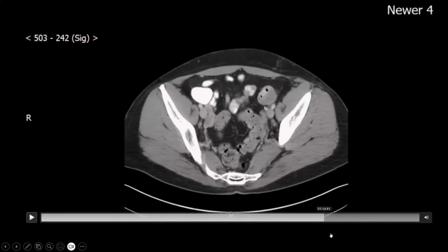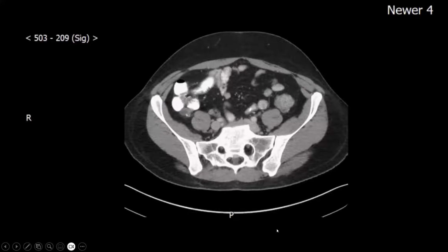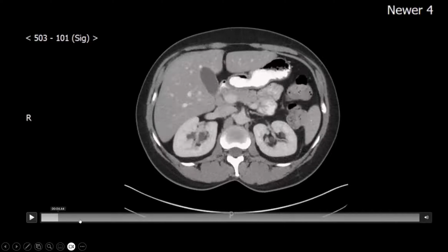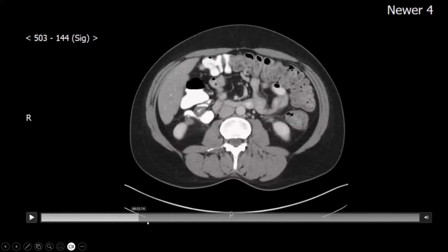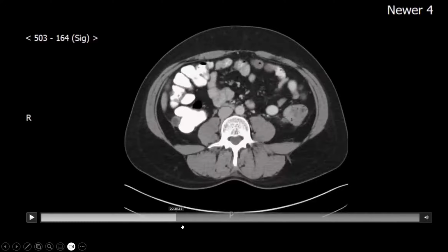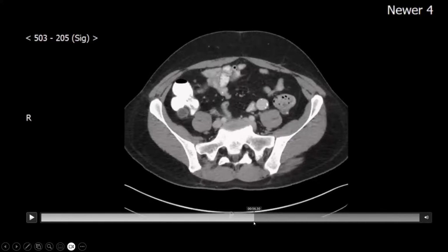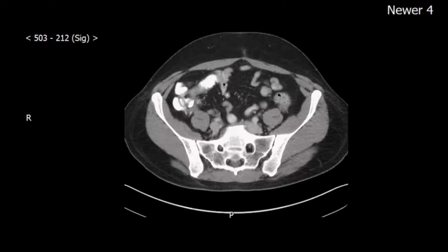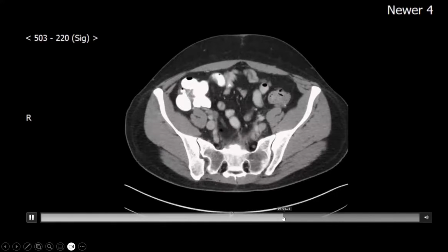Absolutely. Let me show you. The left one wasn't normal either. Yeah, left is not normal either. Is there a distal obstruction? Say it again. Like what's happening here? Does the patient just have bilateral upper tract infections, or what's causing the hydroureter? Before that, should I show you coronal or should I give away the answer? Can you keep going down? I want to keep tracing the ureter. Yeah, keep tracing the ureter.